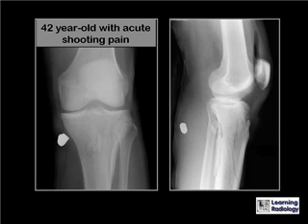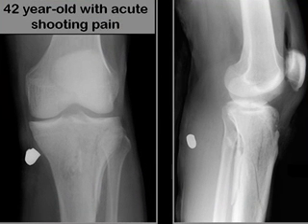This is a 42-year-old with acute shooting pain in the knee. What do you see?